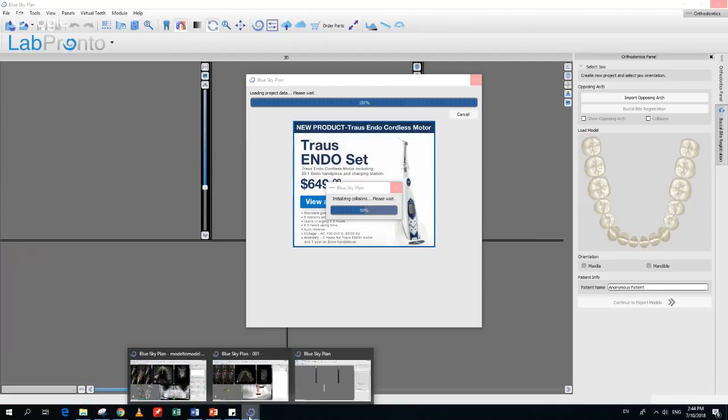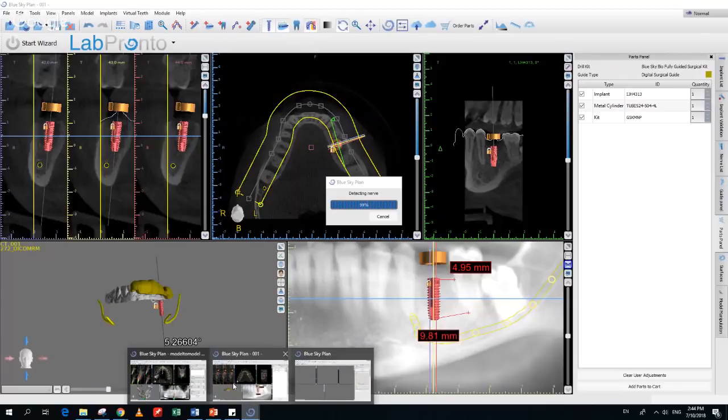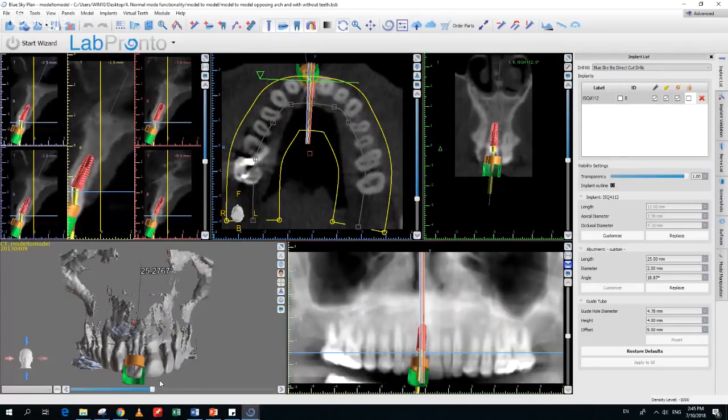But just a word about that, a great way of creating a surgical guide without even pouring up a model is just by using an impression tray at the time of the patient's CT scan. They should have it in their mouth. It's a good idea to put markers on that tray so that if there is noise, then you could use the markers for perfect alignment, and it streamlines the process flow.